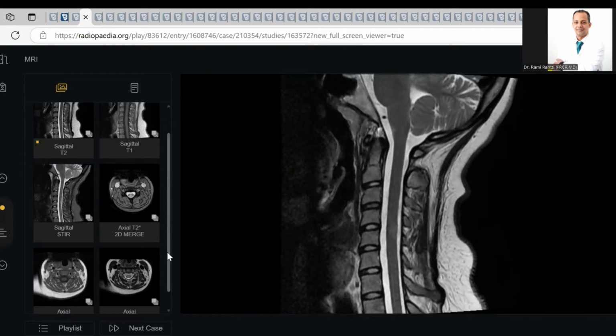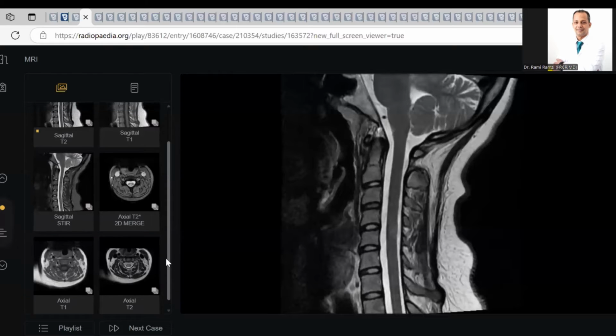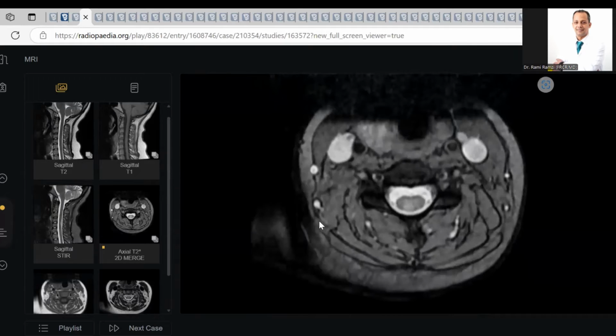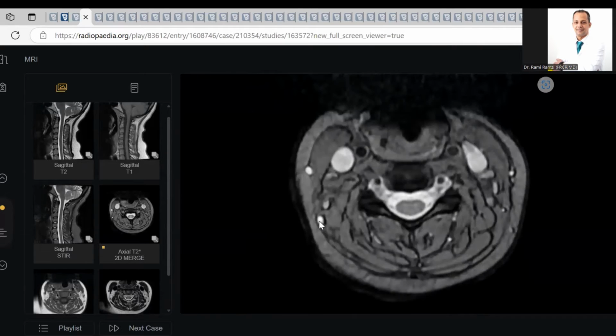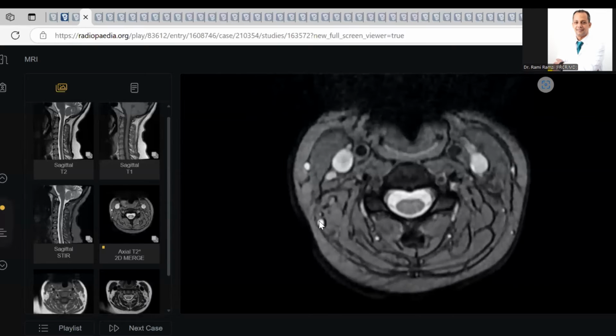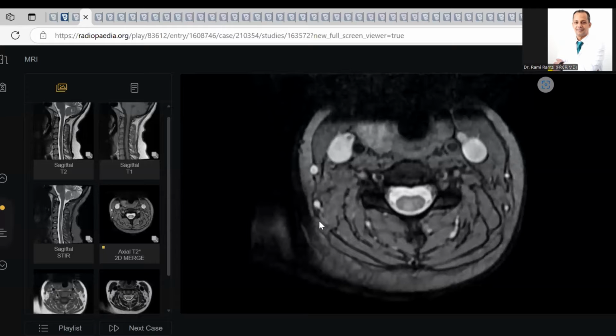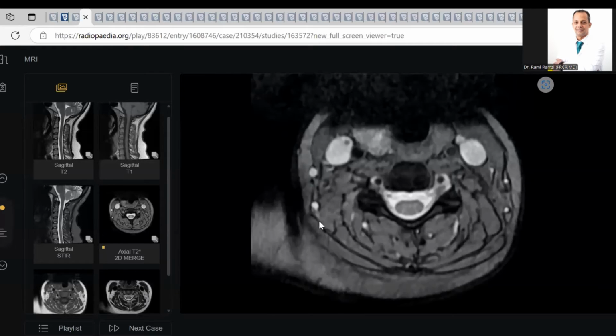Axial T1, no, before contrast. You wanted to see something else? Sir, T2 fat sat axial or STIR images. In STIR, I can see there is hyperintensity more visible on the posterior aspect of the cervical cord. There is not much gross expansion of the cord at this level, and this is partially involving the cord in a triangular configuration. Less than a hemisection of the cord is involved, and a small segment of the cord is involved.